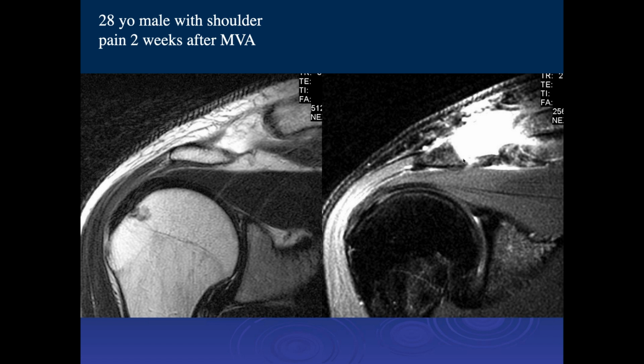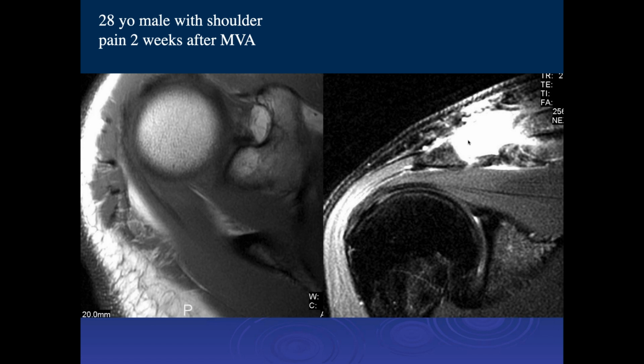It's probably posterior to the clavicle because we're pretty far anterior. So here we're posterior. Because the articulation of the acromion is very anterior, and we see the distal clavicle posterior. And anteriorly where the acromion articulation is, we don't see the distal clavicle. So this is a posterior dislocation. This is a type 4.